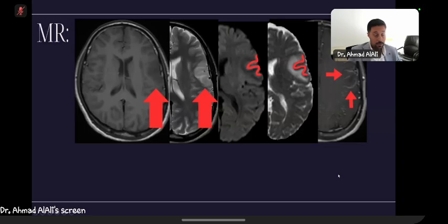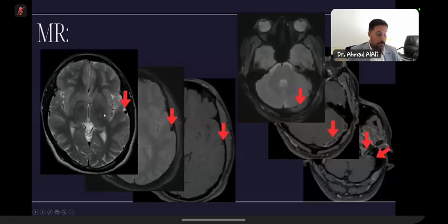In arterial insult, the leptomeningeal enhancement happens in the subacute stage rather than in the acute. In the venous infarct, it is earlier, and it also can indicate some congested cortical veins to compensate for the thrombosed cortical veins and the transverse sinus that I already mentioned. As you can see here in the T2 images as well, you could see the dilated signal void, which is also very important to see in the SWI or gradient echo images.